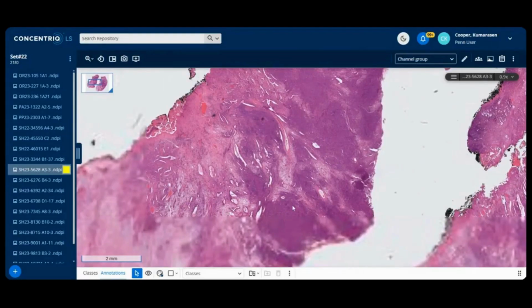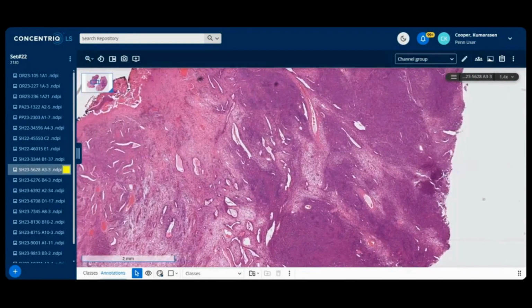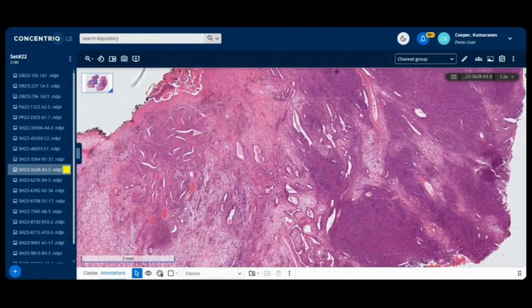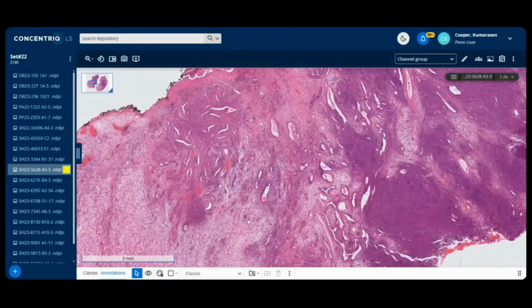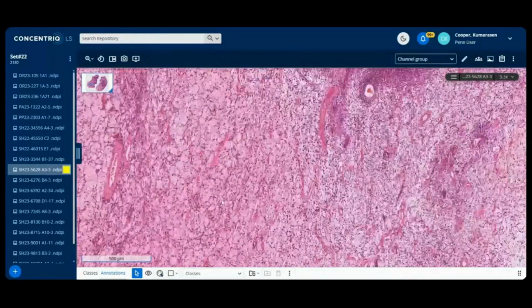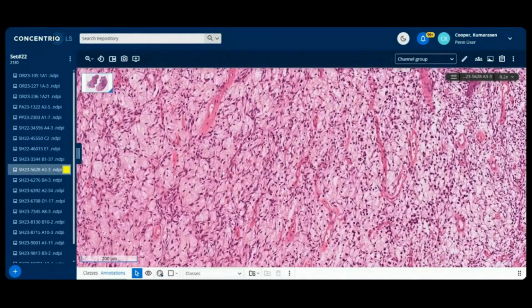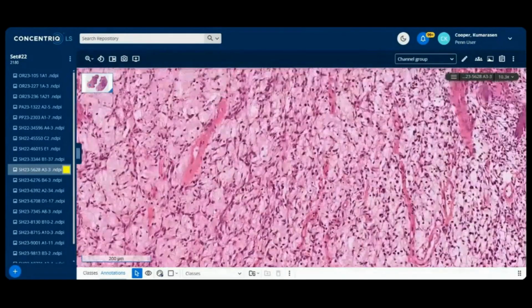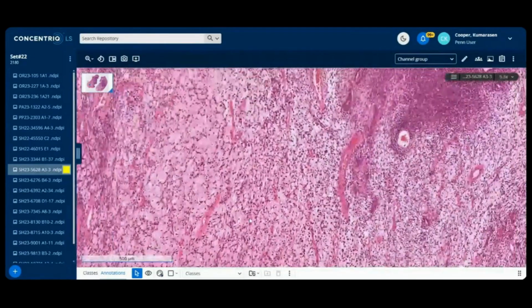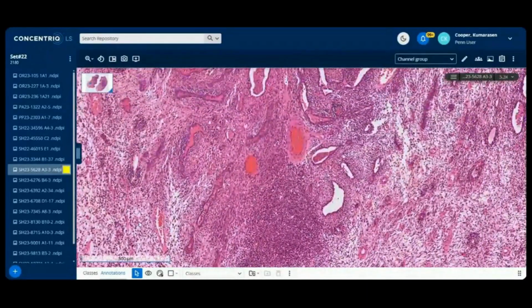And you can see the tumor here quite clearly, a hypercellular tumor with many of these vessels in the periphery. They're showing the so-called staghorn vasculature, a nice clue that we use to identify neoplasms. Here it seems to be the same tumor with a somewhat myxoid stroma, and you can see the pattern of the tumor cells, almost lacy form here. Again, I'm just giving you descriptions as I see the slide, not deliberately intended to focus on a particular pathway of your thinking as well.